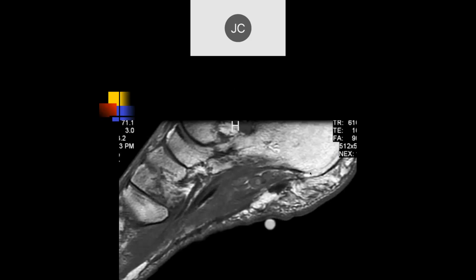Okay, thanks, John. The vast majority of the plantar osteophytes in this location are not edematous by MR. However, there are a few of them which are edematous by MR, and probably what can occur is you can get an osteophyte in this location, and with running or walking or increased activity, you can actually contuse it. But I think that's a very rare cause of pain.